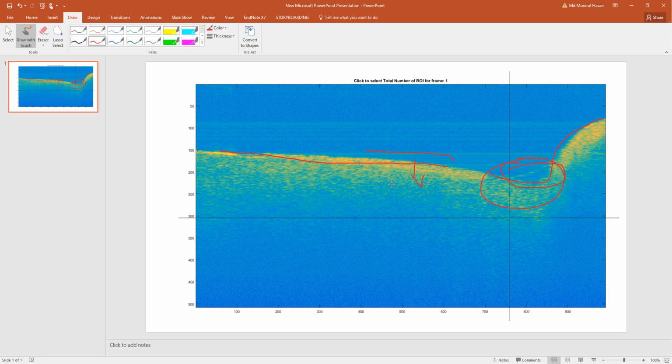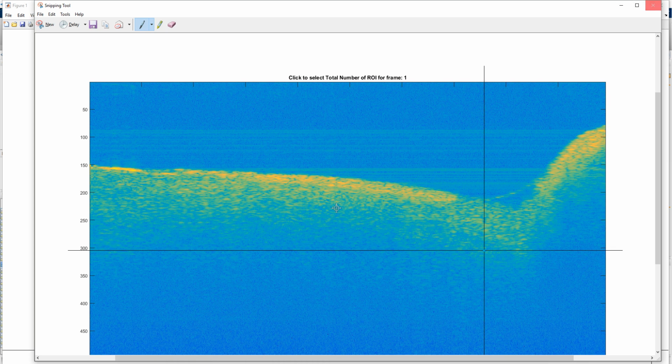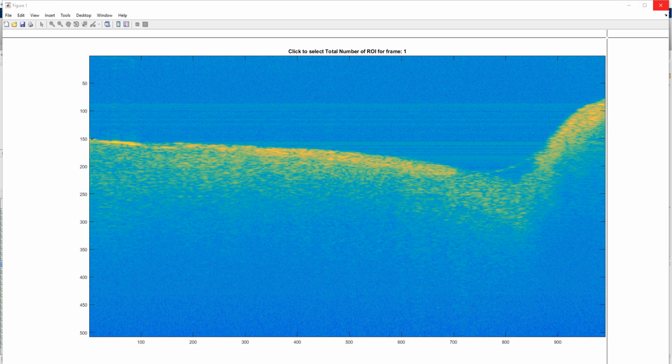This surface is the problem here, because when we detect the one surface and we do the polyfit, it cannot determine the surface properly. So what I did is I rewrote the code to detect the surface properly. So the procedure of my method, I will explain why it's better.